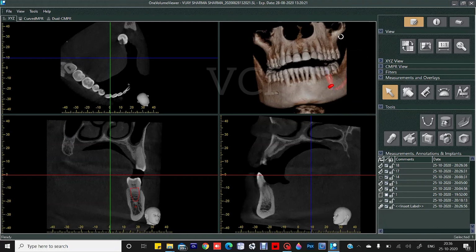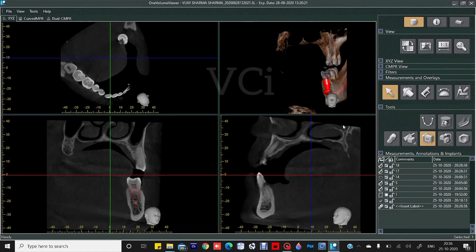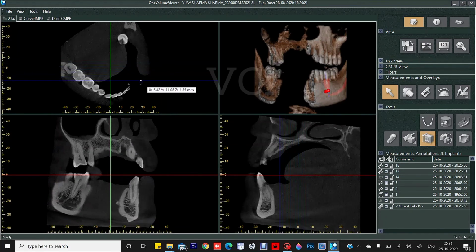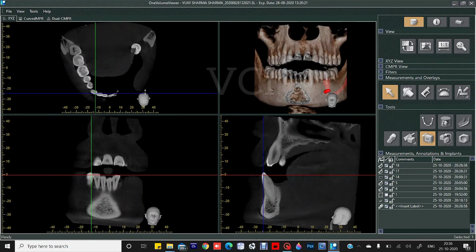Now you have something known as dynamically cut the volume along Y plane, that is the coronal aspect. So just press this button. From the coronal aspect, your entire section is again cut. So you can just move this blue line, and accordingly you can just see it again.